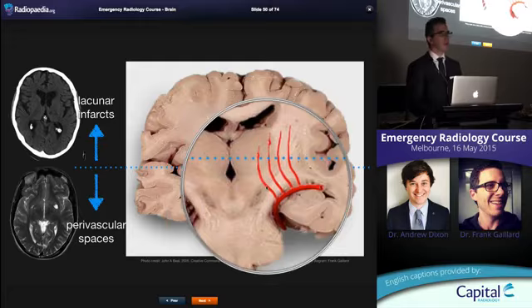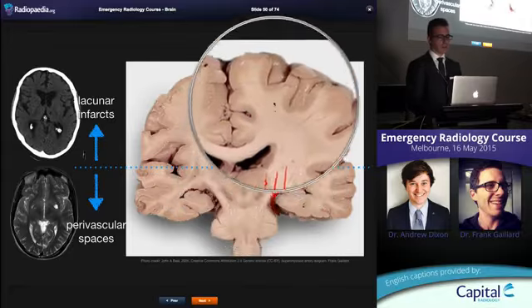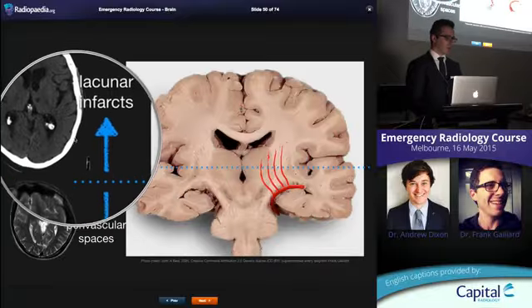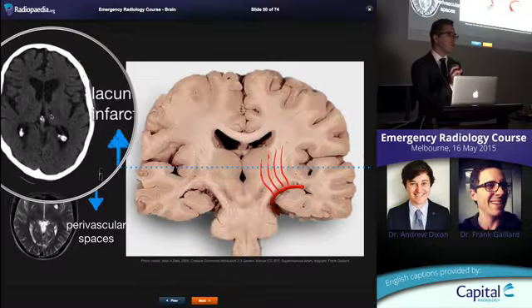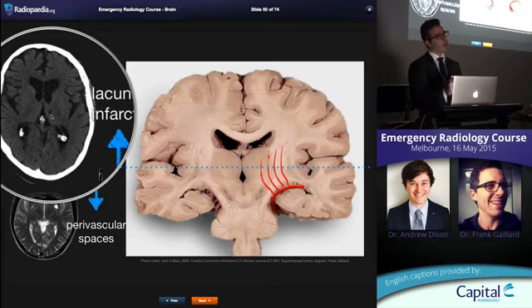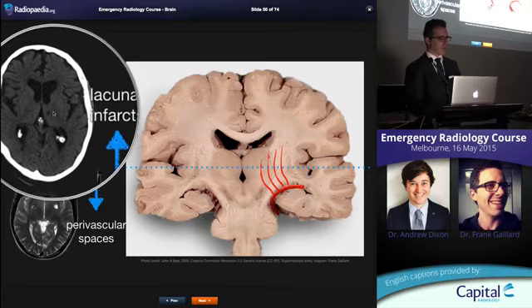It means absolutely nothing, it does not cause symptoms, will not cause symptoms, it's normal. Anything above this shows that this patient has had a bit of brain that's died from a vascular event, means a lot. In terms of how it looks on CT, very hard. In terms of the actual hole, they look quite similar. Lacunar infarcts tend to be a little bit more spindle-shaped because they're sort of a little cleft and then the brain around it contracts. They can be a little bit ill-defined, like this one, because there's a bit of gliosis around it, a bit of scarred brain tissue.